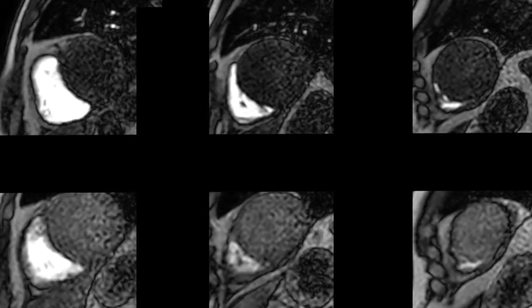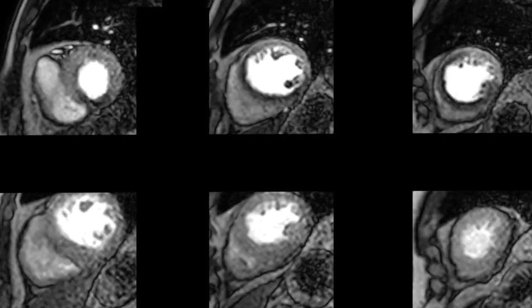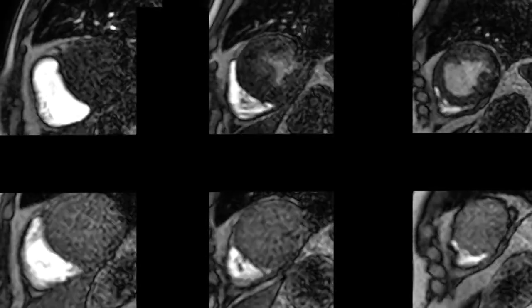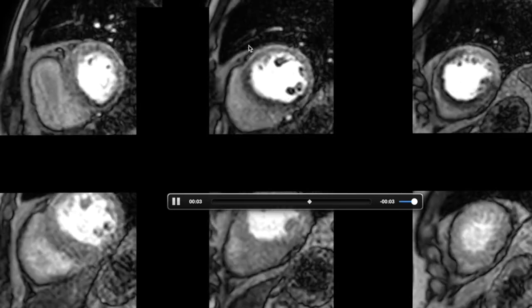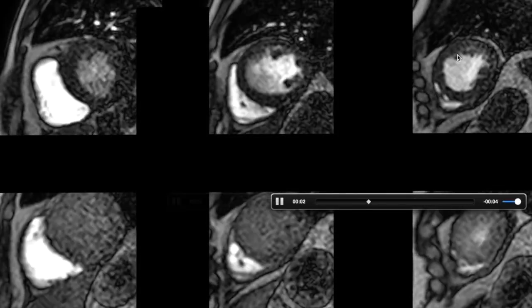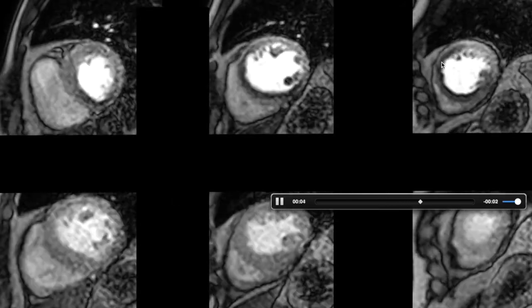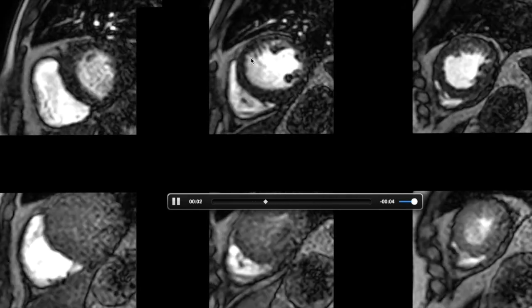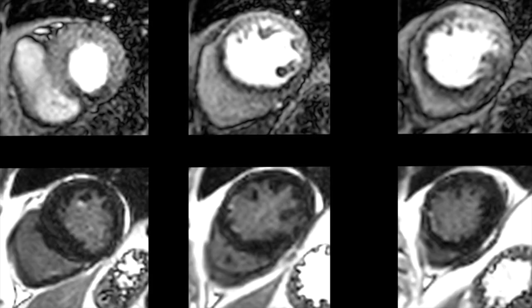These stress perfusion images, followed by the rest perfusion images, show areas of hypoperfusion on stress imaging involving the mid and apical septum, with some involvement of the apical anterior segment, and mid anteroseptal with mild extension into the anterior segment. Let's look at some of the representative images.